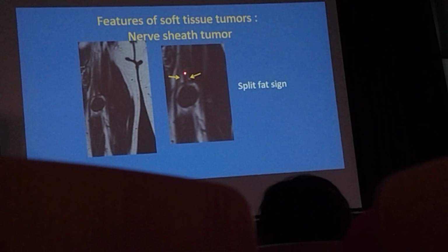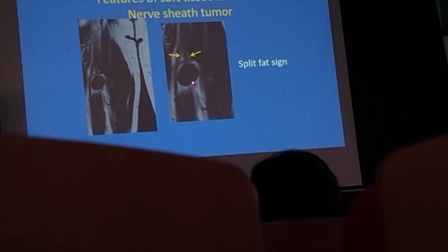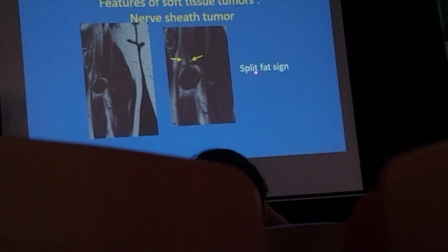And this is the split fat sign, when the nerve goes through the fat that's splitting, and this is the mass.